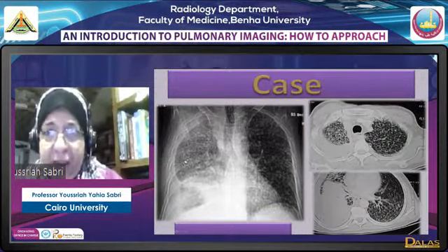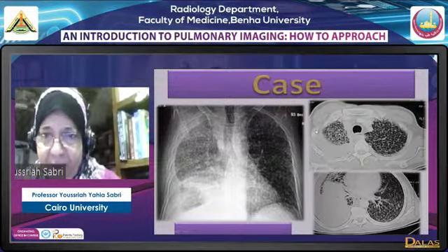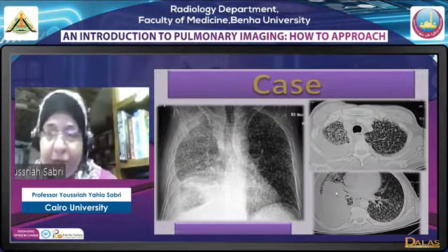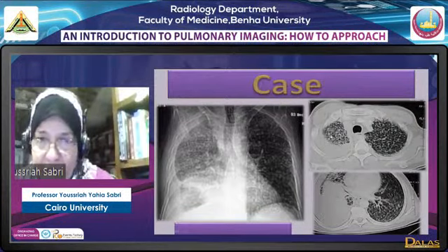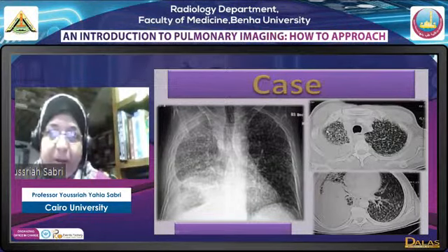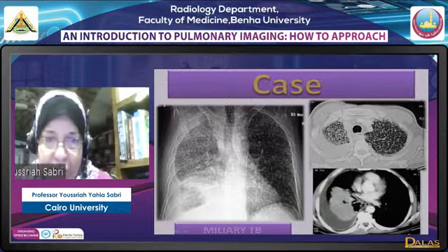This was actually a case of miliary tuberculosis. In addition to the miliary shadows, we have the effusion and we have a consolidation here. Now, mind you, in this effusion in the supine position, the margin of the effusion is parallel to the rib. And this means I'm dealing with a free effusion. It is exactly parallel to the concavity of the ribs where it is present, okay? This is effusion. Multimorphic lesions where more than one lesion is present suggest tuberculosis.